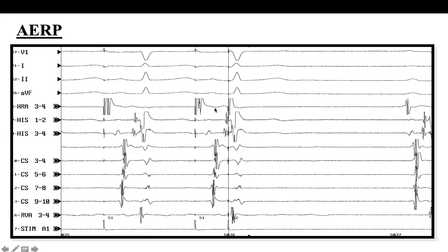We'll start with the surface ECG and the intracardiac tracing. Good. And it shows there is an atrial stimulus. Excellent. And it goes through the H and V. Excellent. But it's concentric. Okay.